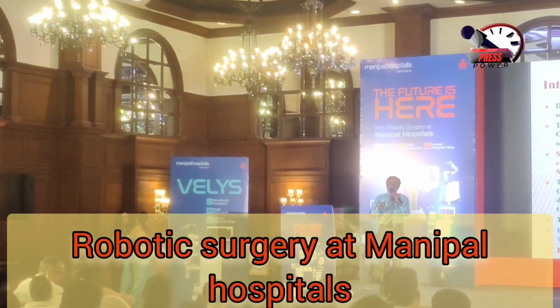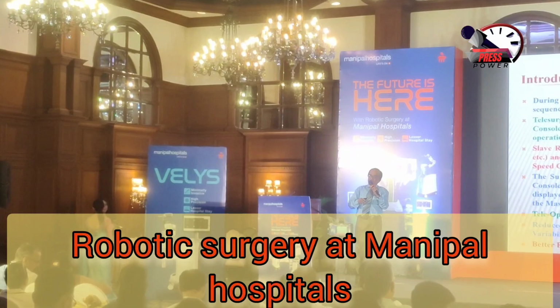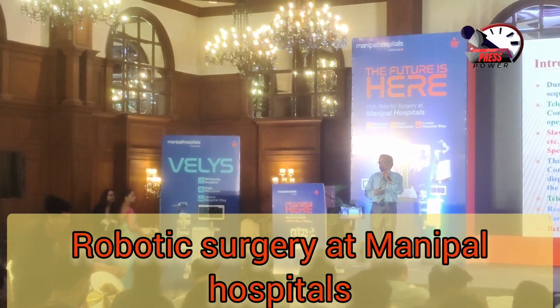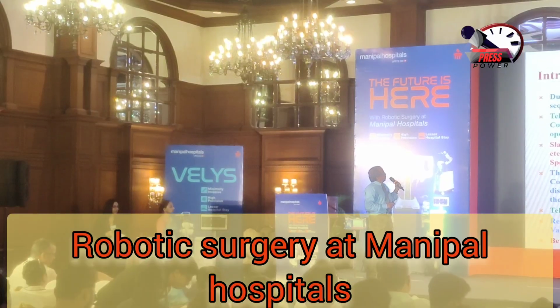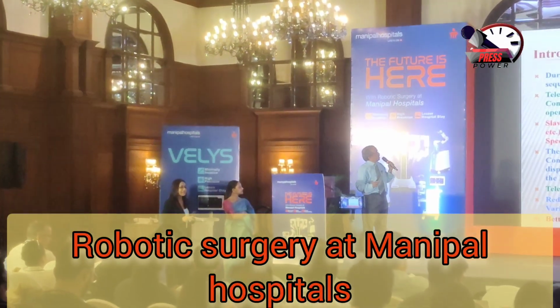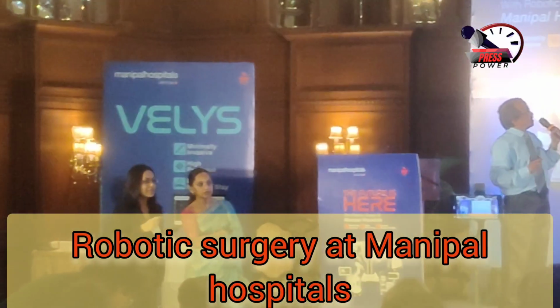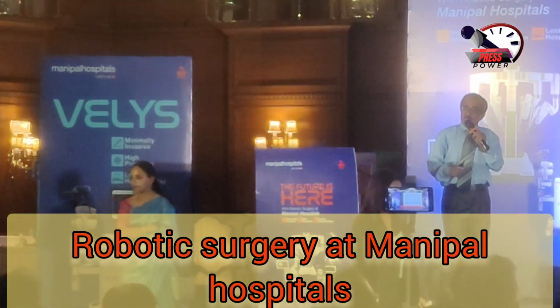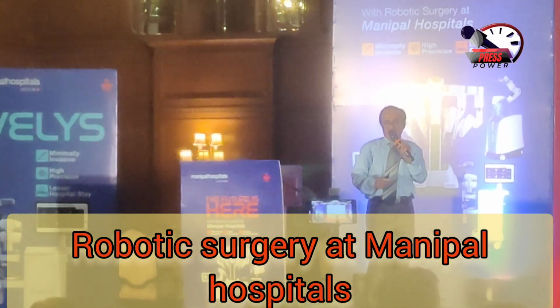But before that, there is another very difficult problem which I have not yet discussed, which I am going to tell you. Now, all of us will know that during the surgery, a surgeon performs a set of activities in a particular predefined sequence.